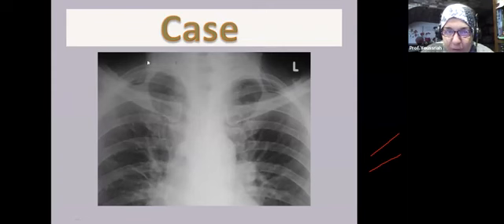These soft tissues on both sides of the lower neck are the sternocleidomastoid shadow, sharply demarcated as you can see here and extending downwards on the apex of the lung, bilateral. Above the clavicle, we have the companion shadow of the clavicle. So we have the sternocleidomastoid and companion shadow of the clavicle adjoining each other and adjoining the shadow of the first rib, giving a false impression that we have a cavity. We might have a false impression that we have bilateral apical cavities here.